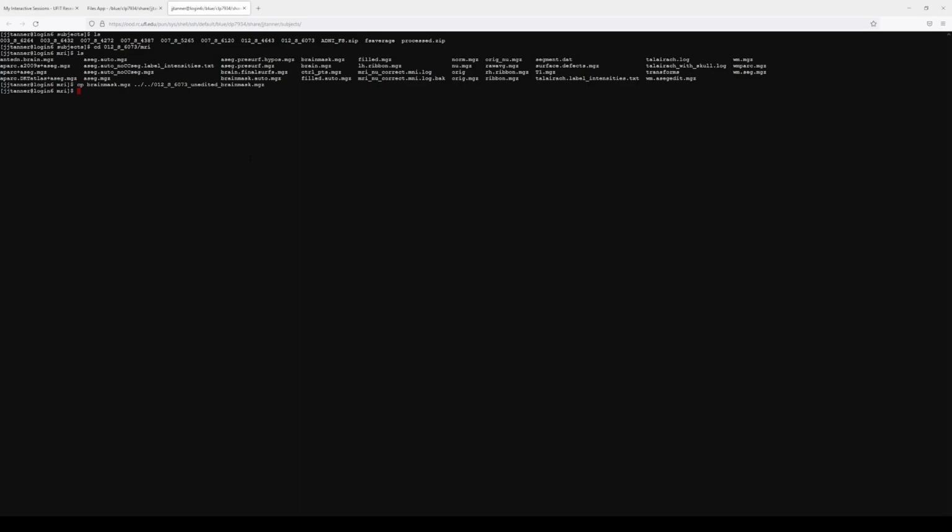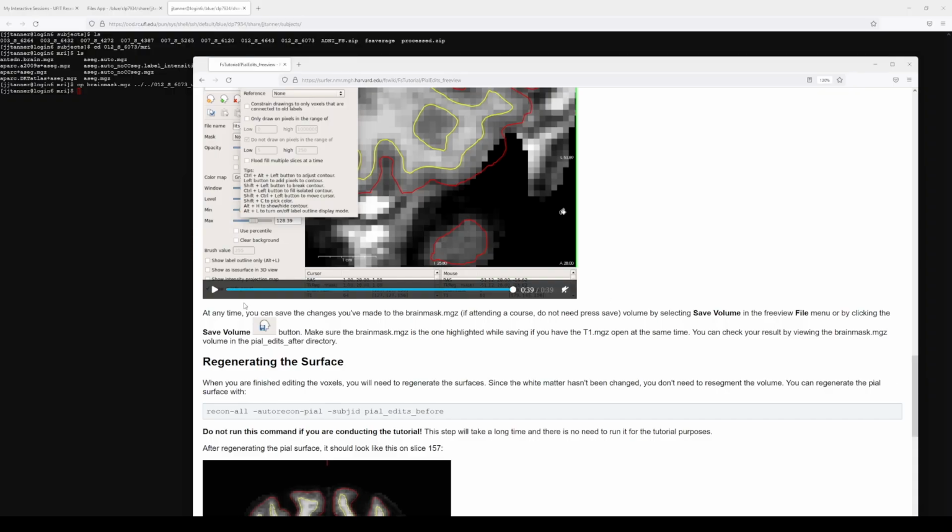And what is in that script would literally just be the header information, module load FreeSurfer, change directory into your subjects directory. You do export SUBJECTS_DIR to equal that directory, and then you run the command like this. But let me just show you the other way.